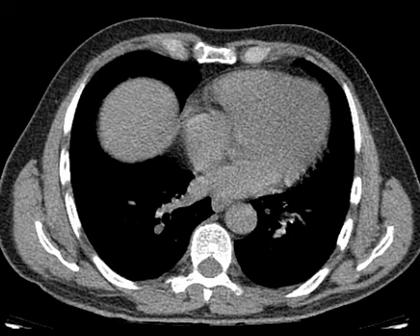Bismillahirrahmanirrahim. Assalamu alaikum. Today we will look at the CT scan and we will discuss the importance of clinical history as well as the subtle findings we can find in the CT scan.